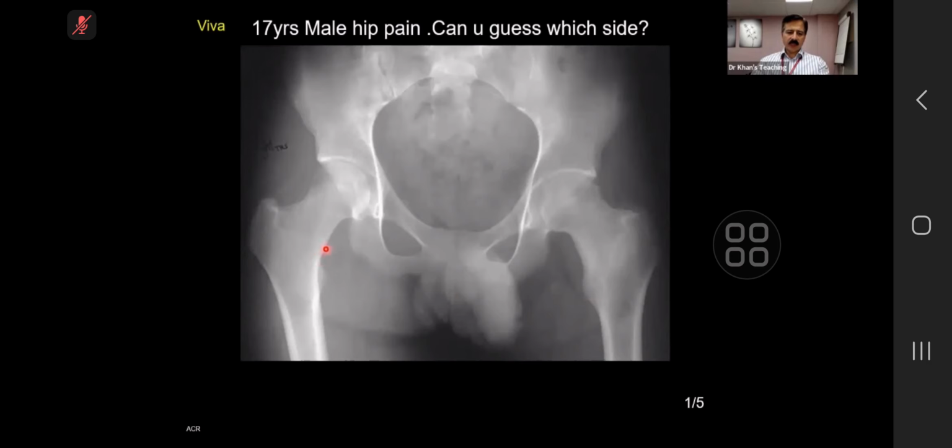The whole sort of femoral neck appears more radiodense. Okay. Now, if you see here, what is happening, this is a classical exam case, and why it is a classical, I will tell you. Because the osteoid osteoma sitting here, I'll show you, that might be difficult, but you pick up this cortical buttressing where you can see this thickening here versus this.